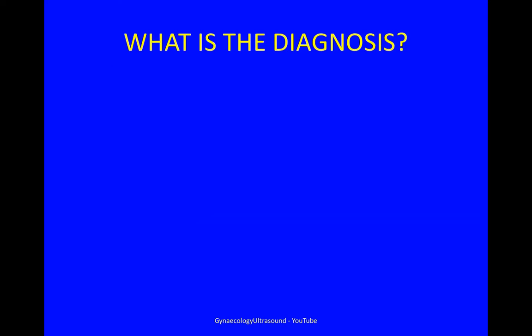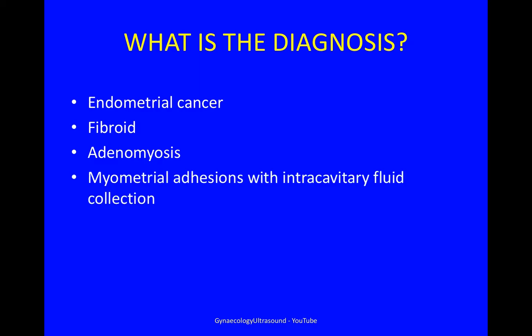What's the diagnosis? Is it endometrial cancer, a fibroid, adenomyosis, myometrial adhesions with intracavitary fluid collection, or an endometrial polyp?